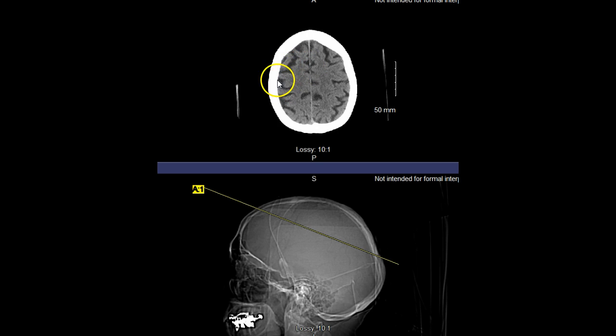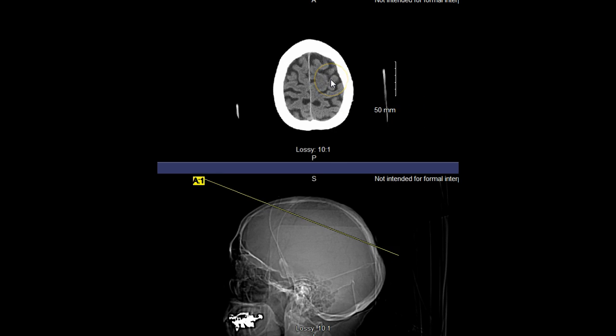So the sulci are any of the grooves that you're seeing, any of those depressions, and the gyri are any of the hills that we're seeing. So you can see the difference here. So gyrus, etc., versus some of these sulci or depressions. Some of them are named sulci. Some of them are going to be named fissures as we go through. But just in general, I want you to get the general sense of sulci versus gyrus.